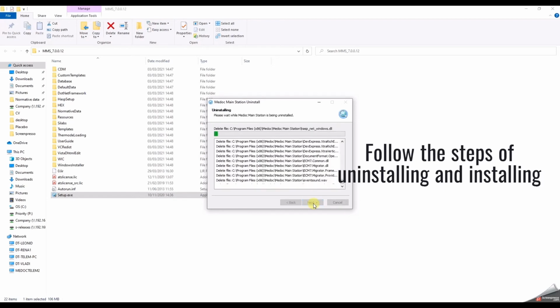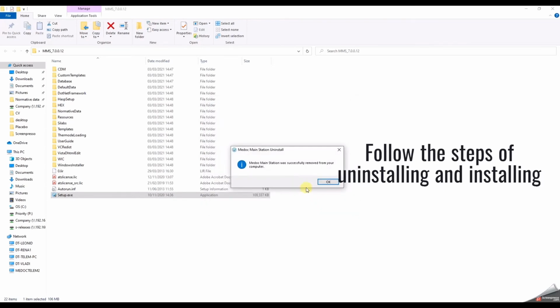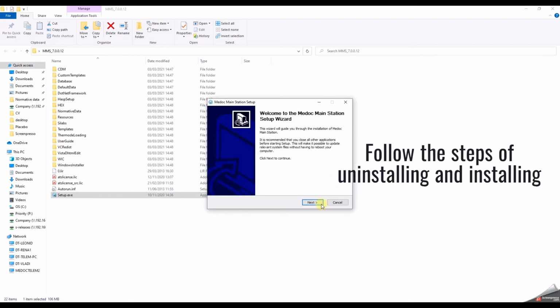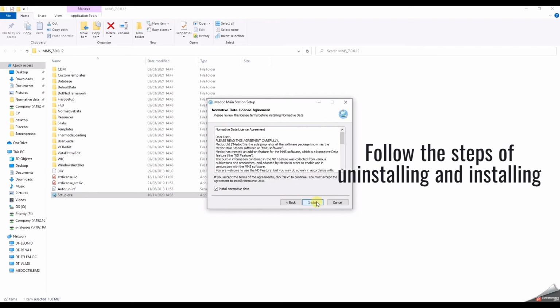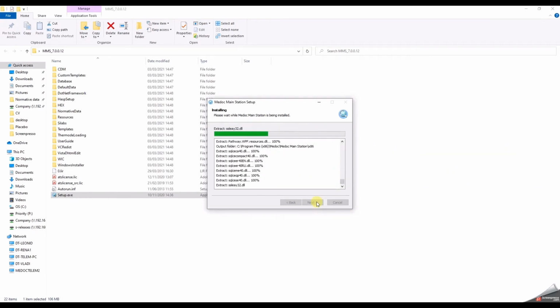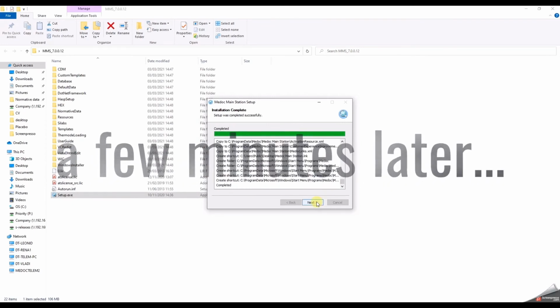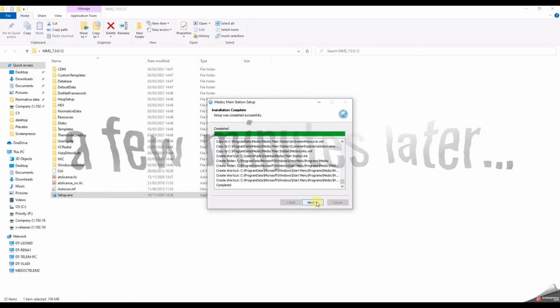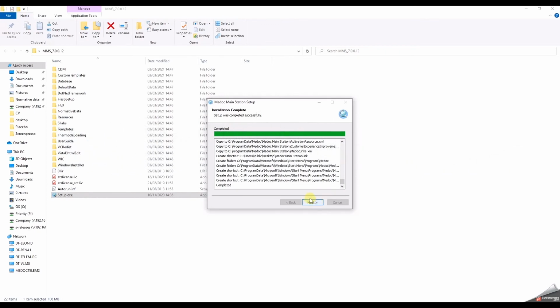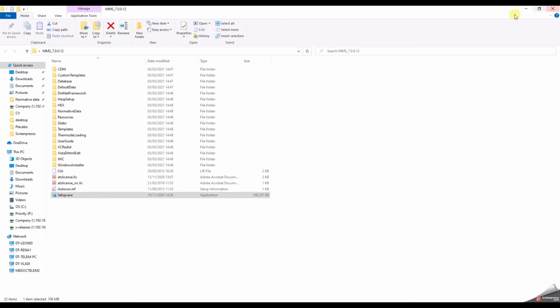We're installing. Click Finish. Okay, we just moved it. And now I'm agreeing to all steps, and this may take a while. So you can walk away and come back in a few minutes. And now we're done. So let's press Next. We don't need to reboot right now. We can do that later. So you can choose that. And let's finish. It's closing this up.